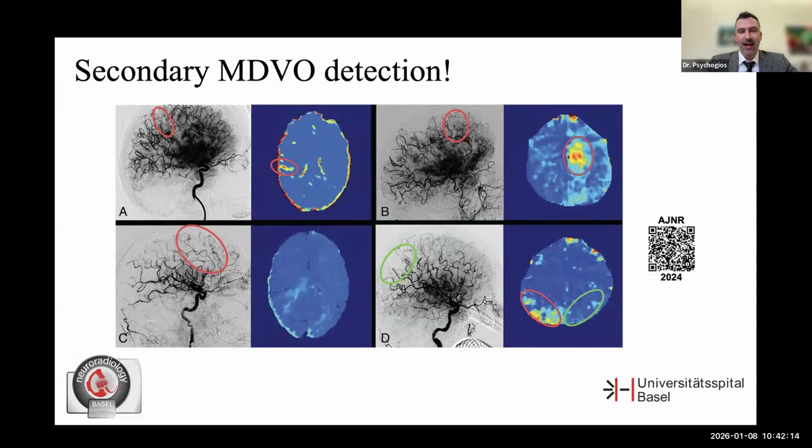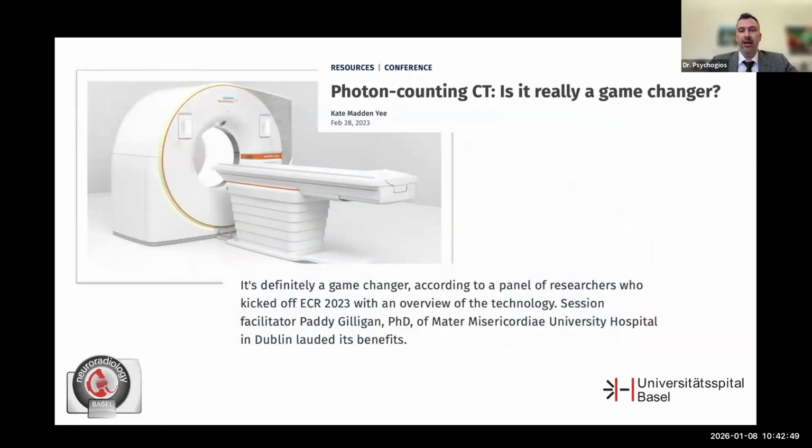These are some slides that we are also going to discuss later about a product that is now available in the angio. So you can now do perfusion on Siemens machines with the flat panel CT, and then you can analyze it with RAPID, and you can get perfusion maps. And those are all TICI 3 examples, where actually you can see that there might also be some residual occlusion left. And then in those cases, you go on and treat additionally with some intra-arterial lytics, for example. Right? So again, this is a really, really important topic, talking about secondary detection.